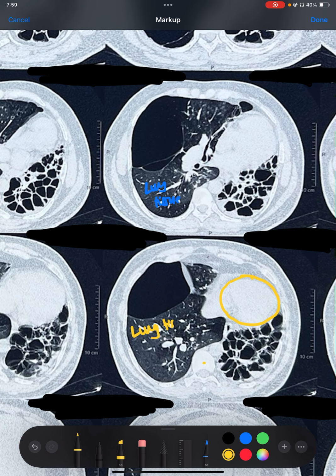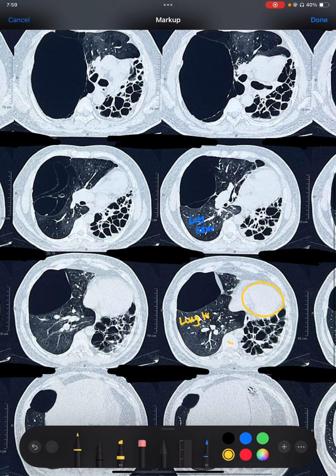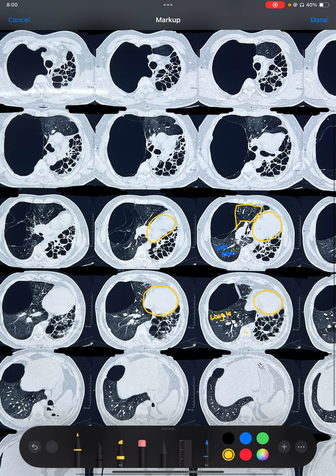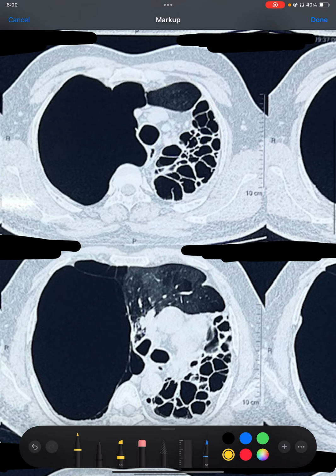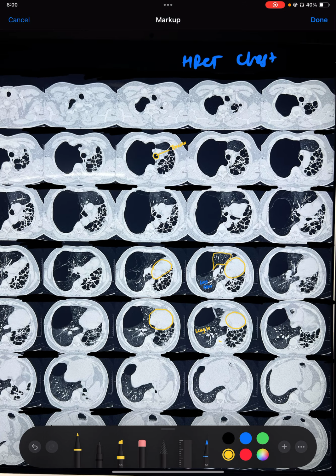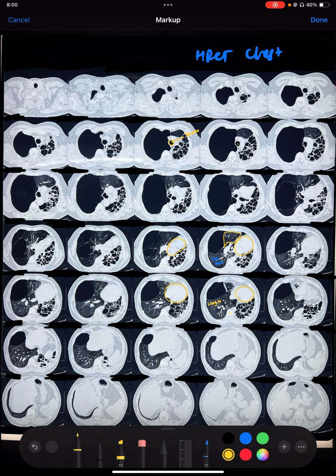This is the thoracic vertebra. So this is all the heart tissue that we can very easily notice. This is the heart tissue. This is the lung. This is the lung tissue, which we can very clearly notice. And this is the trachea. This is trachea because it is in the center, and we can actually trace this trachea here, here, here.